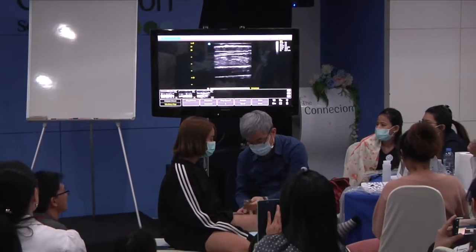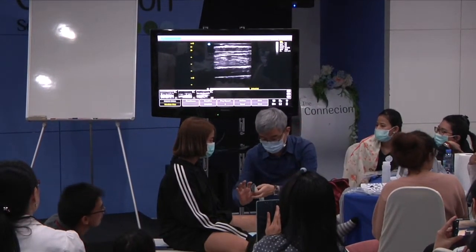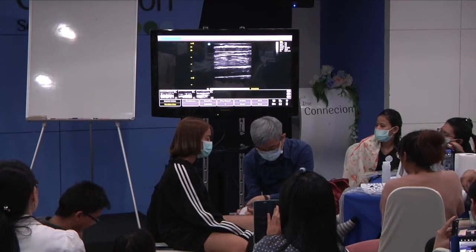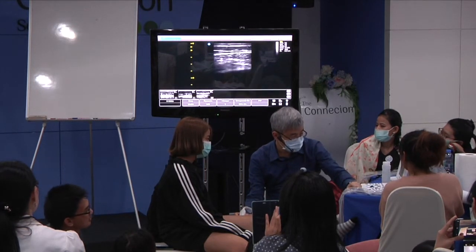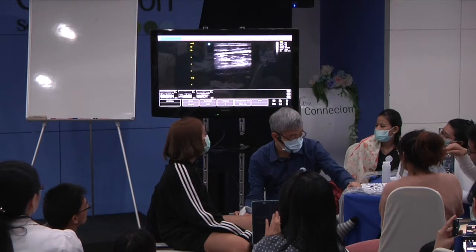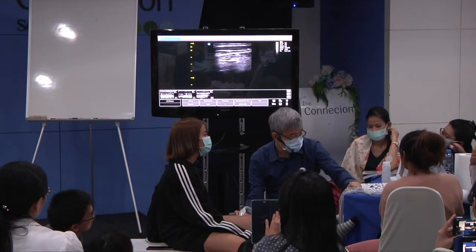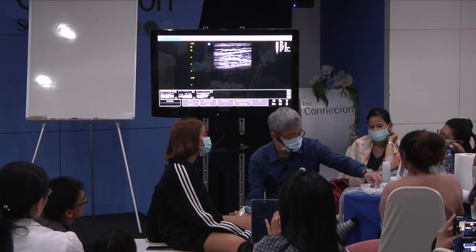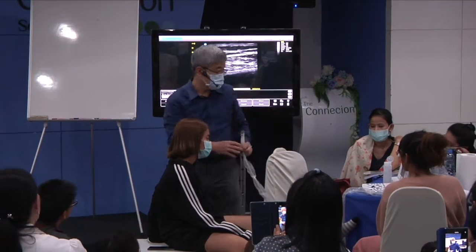If your boss or your teacher asks you to do the morphology evaluations, and they always ask, so don't worry, then plus the image I just showed you, you need to complete another image of pennation angles of the vastus lateralis.